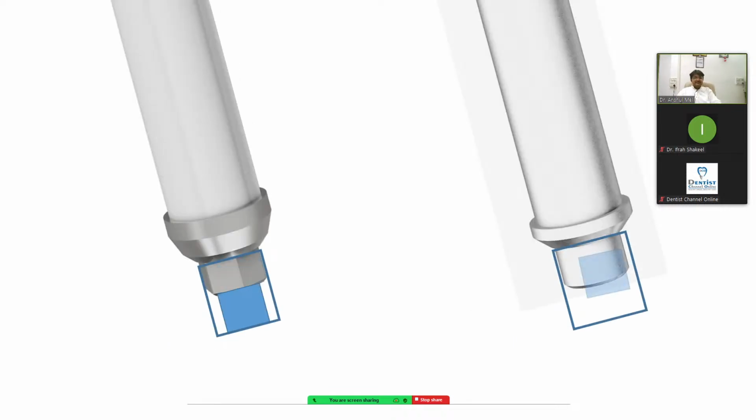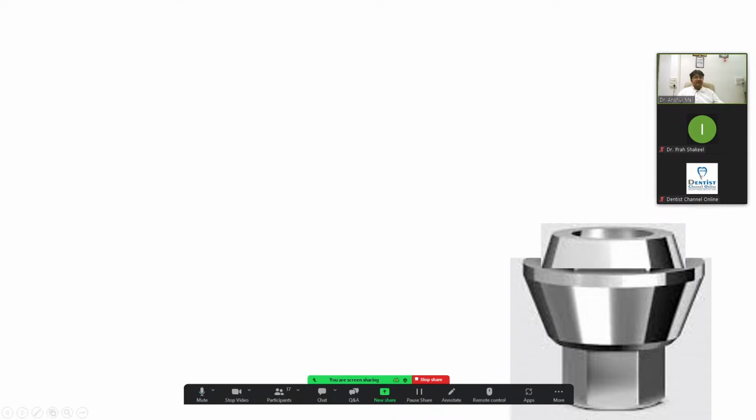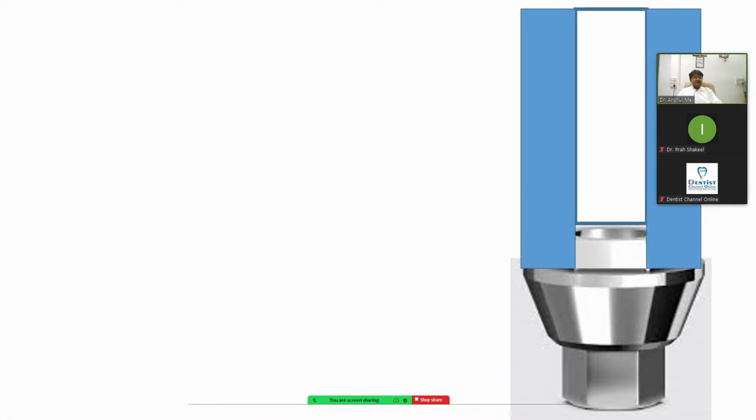The same way, just in a lateral view I'm showing. So this is called the AR abutment from Bioarchitecture company, in which the internal connection is a hex as you are getting from the company already, and the outer external connection is non-hex. So the prosthetic is non-hex. Whatever full mouth you have, non-hex is the best solution when you have multiple implants. So the non-hex is on top and the implant connection is hex.